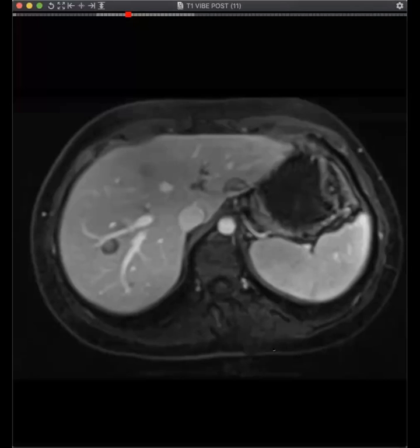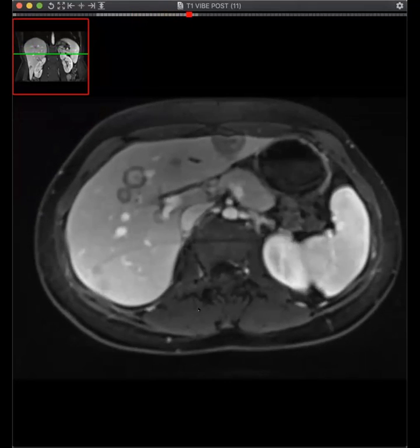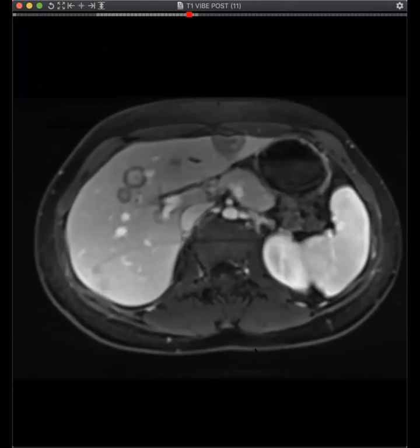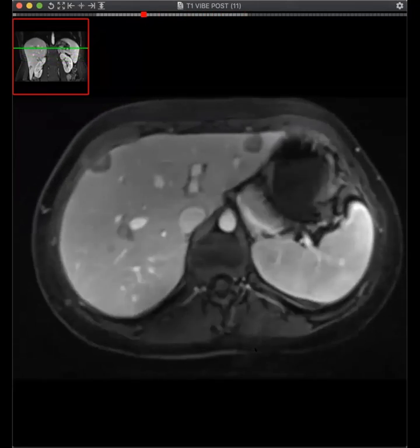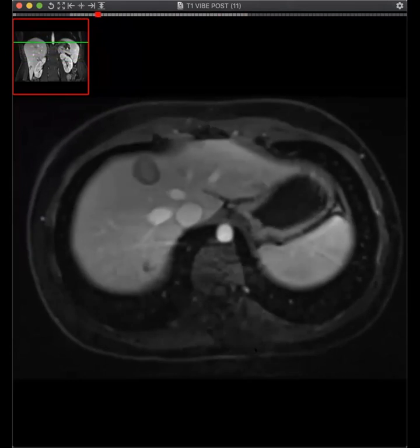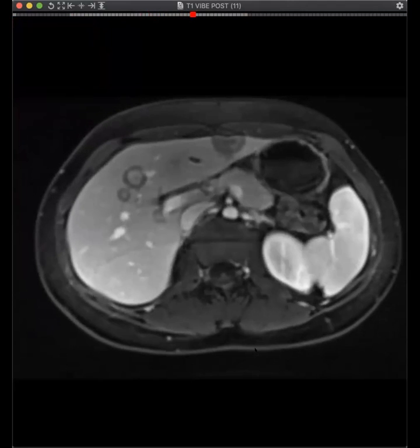Okay, this is awesome. And while Kedar is pulling his case up, Ben, correct me if I'm wrong, but they often have this targetoid enhancement, and there you go. You can see it. Yeah, targetoid enhancement and the capsular retraction and multiplicity as well. They all look the same. They are the two cases I have seen. Both have gotten transplant, and both of them have been young women.